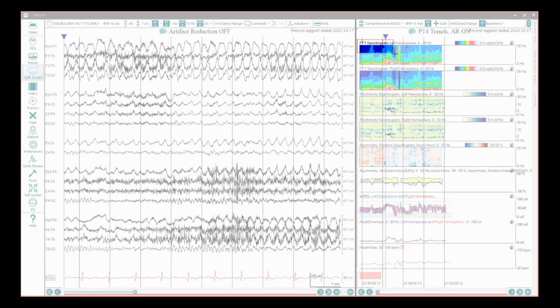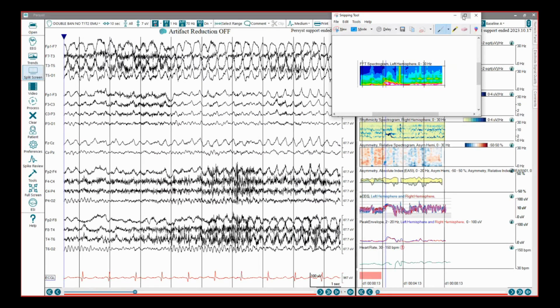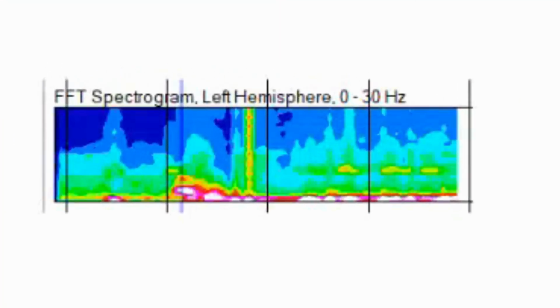And I'm talking about this right there, that white oval. And notice how over time, there's kind of this downward slope, and that's the seizure essentially slowing down. Here is the PDR after the seizure has ended, reemerging. That's the PDR reemerging right there.